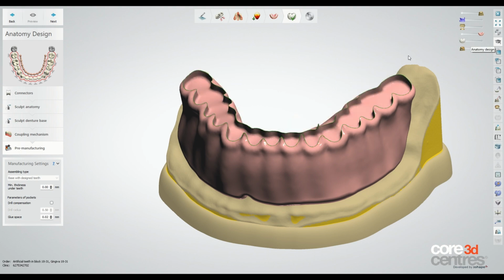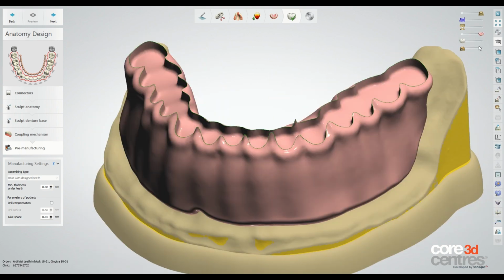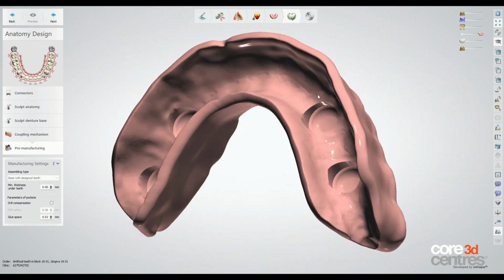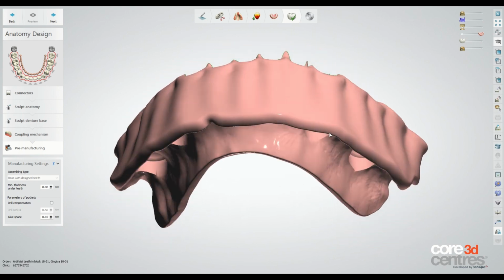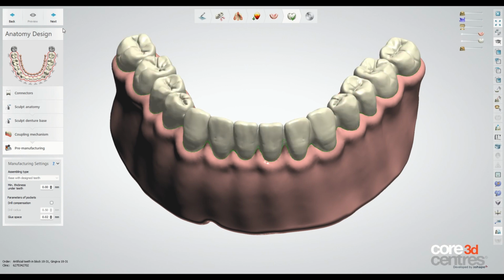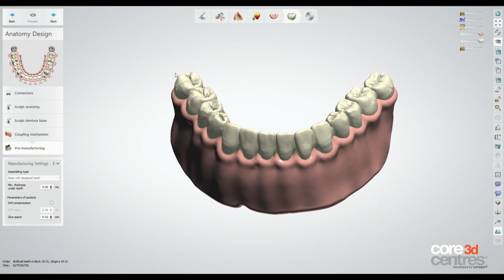Verify that all denture base housing space is generated correctly and that no defects appear on denture base and teeth, otherwise correct as needed. Once satisfied, the design can now be finalized. Click Next to export the design and send the denture for printing, curing, and polishing. At this point, you can place the PreatLoc abutments on the model and pick them up at the lab and send the denture with abutments in the model to the doctor.